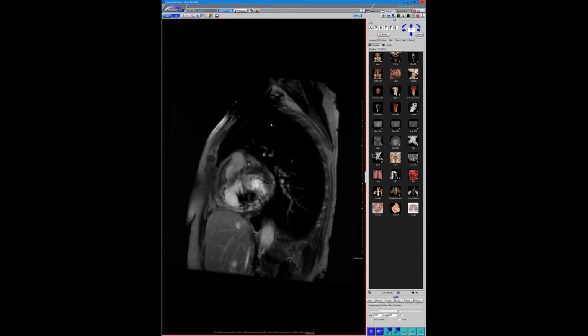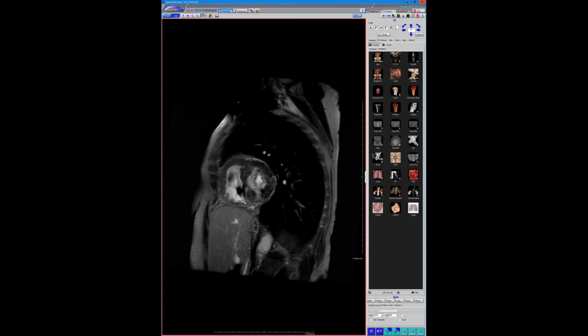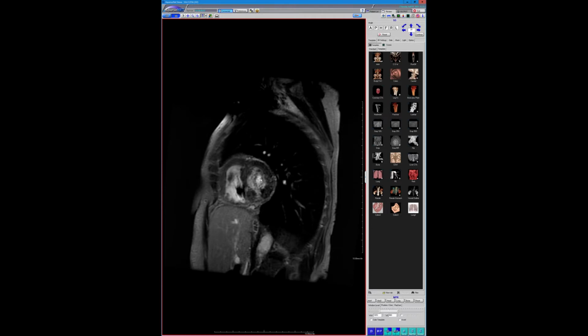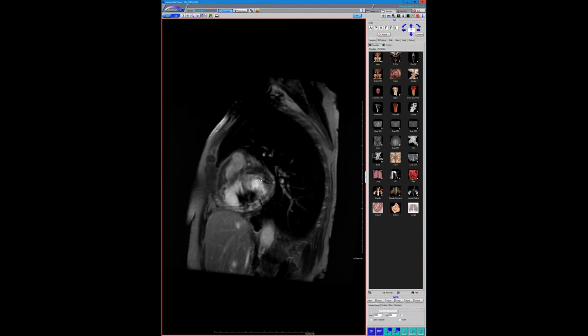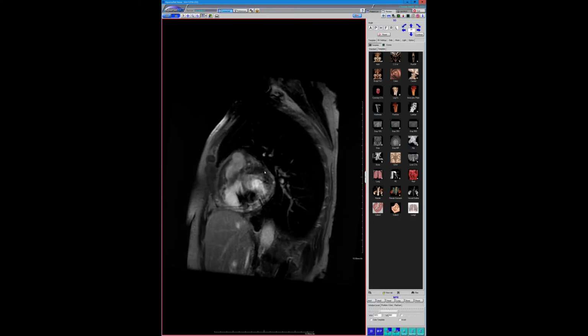I agree. It can throw you for a loop when you see it on MR, and the CT is so much better. But I've seen a few cases like this where the edges of it are enhancing, and then it's variable T1 and T2 signal, but usually the caseous part is typically T2 or STIR, right? Yeah, we didn't get any T2 through it. We have a tissue mapping, and on the T1 it's pretty low signal throughout.